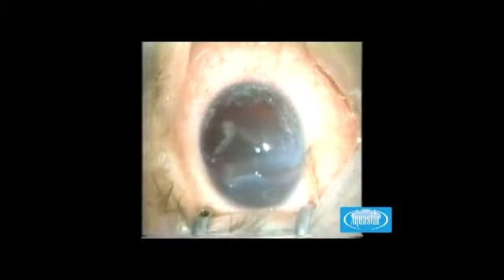In addition to the wide application spectrum of the elements in the most diverse defects of the iris, this prosthesis has a further advantage in its immediate availability. Thus, for example, one-time primary treatments of severe perforating injuries can be carried out directly by incorporating IPS elements.